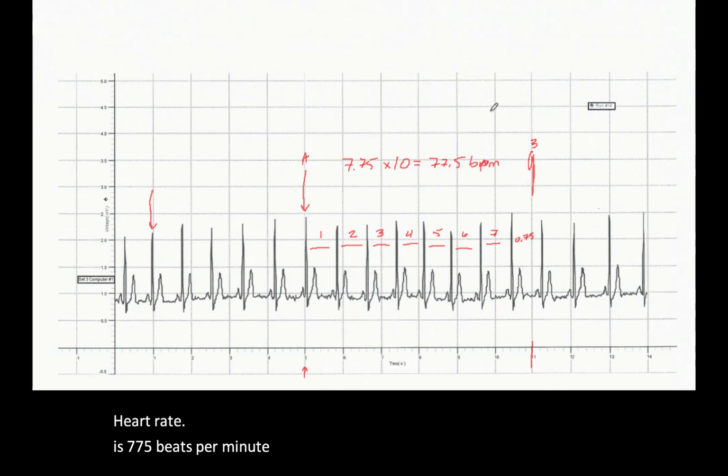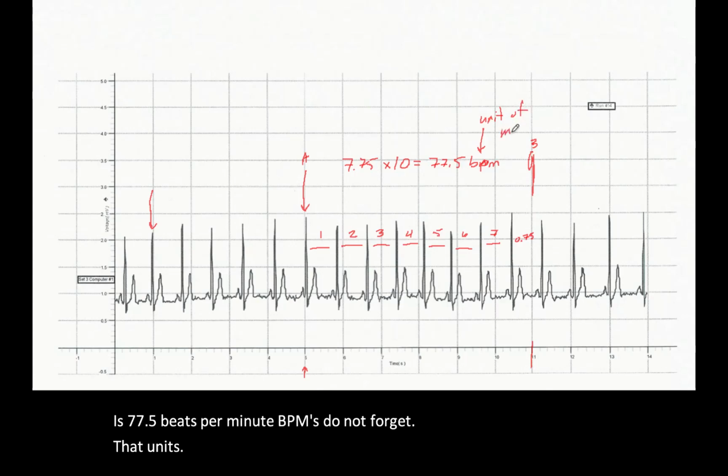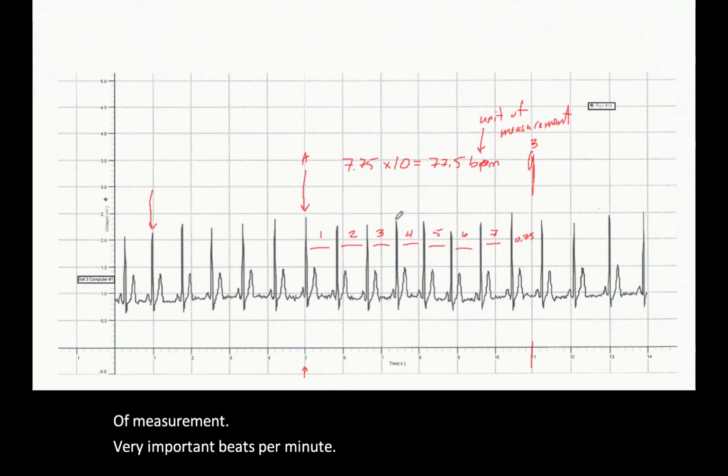BPMs. Do not forget that unit of measurement. Right, very important. Beats per minute. And that is how you calculate heart rate.